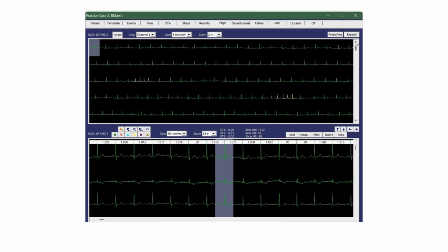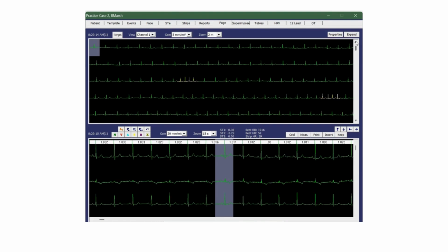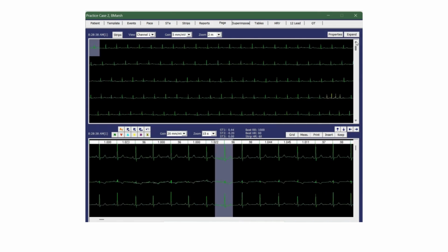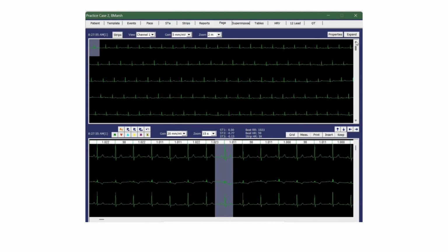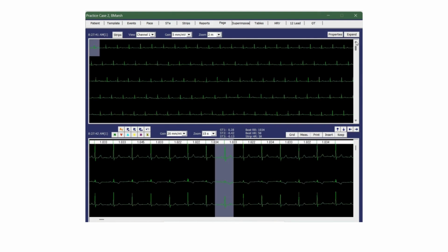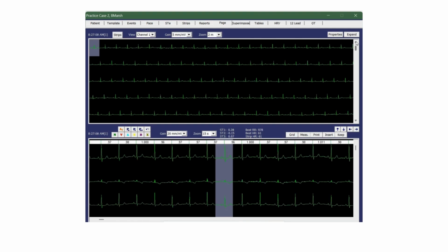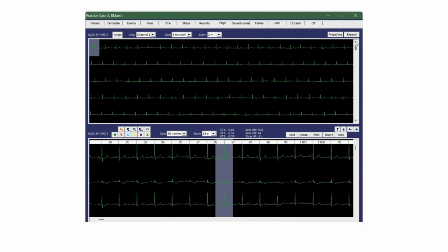Now, of course, we want to show the physician the most serious thing first. So if the person has a single VPB somewhere in this time frame, that is less important than somebody who is having a SVPB run. Right? A run is more significant than an isolated beat. So just keep that in mind.